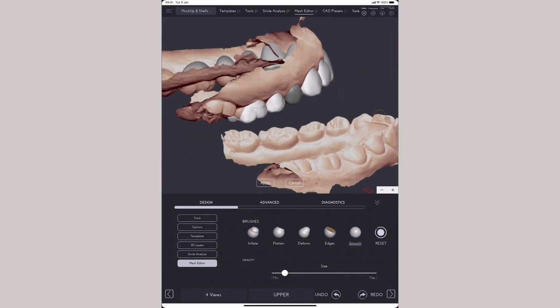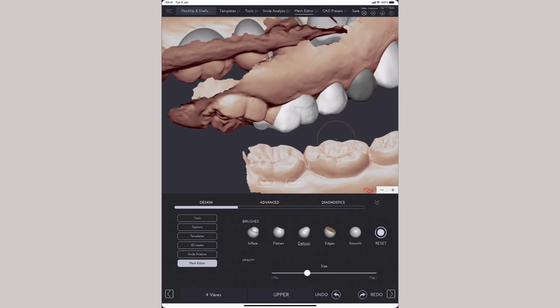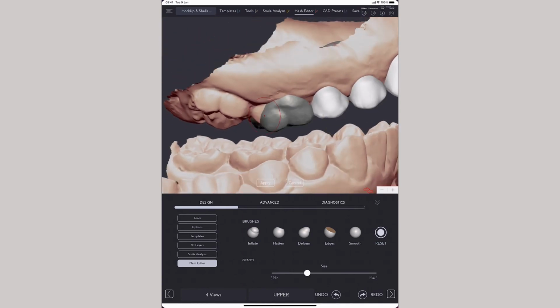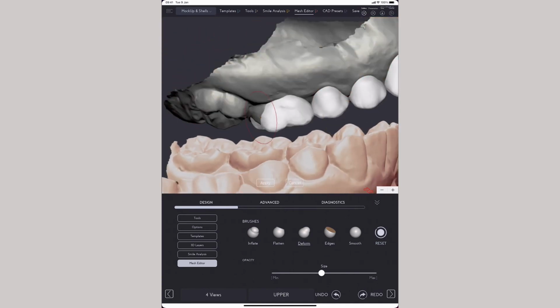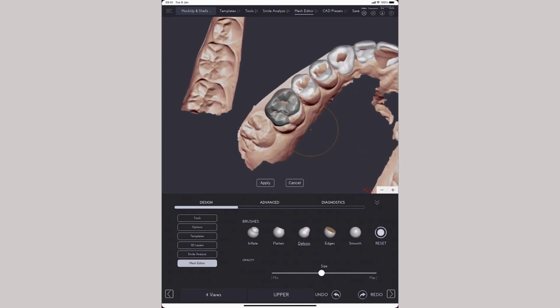And this is where the stretch option comes in. So if I tap on D4, tap on undo. If this happens, select the tooth, and then you can drag it out. See? So you're changing the size here as well.